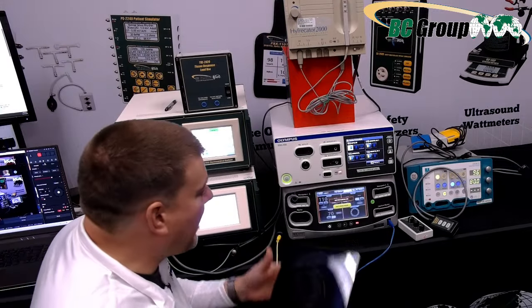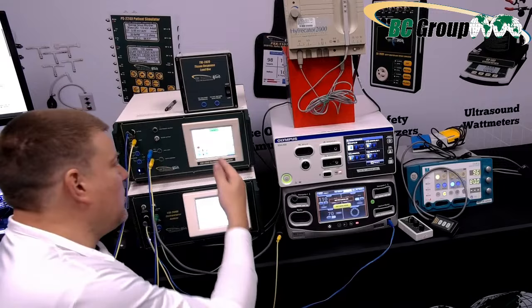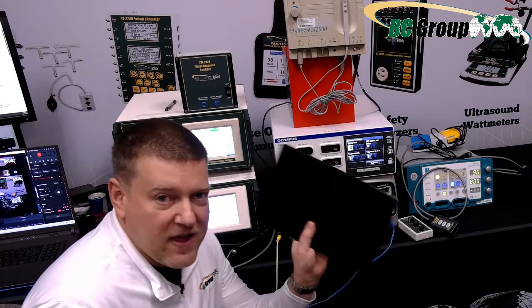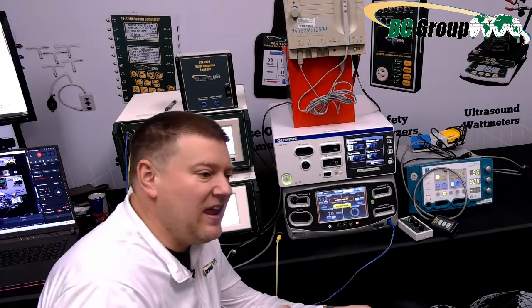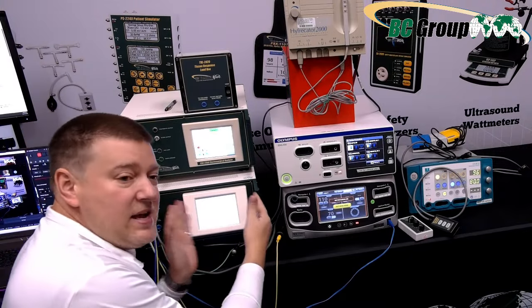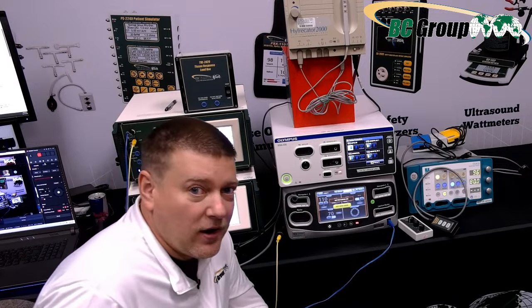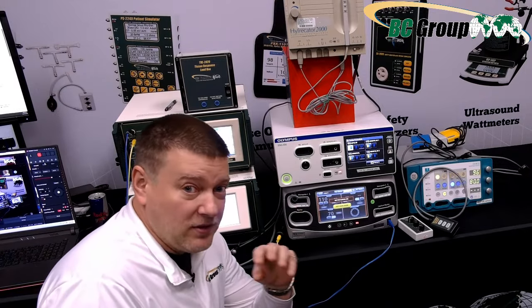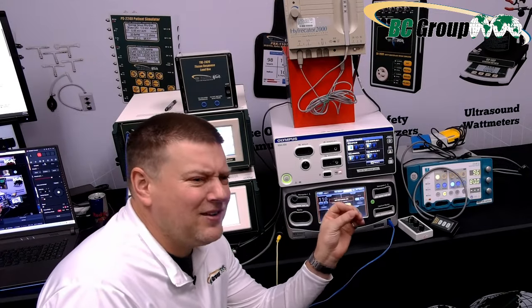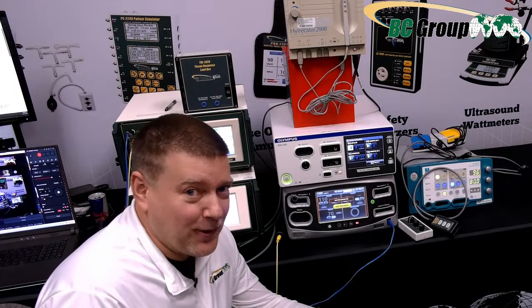This telephone operator and trying to guess what's going on where is no longer the case. We have pictures that show us what to do. We have apps that guide us step by step, and it automatically captures the energy and builds out a PDF report that you can attach to your work orders. Or if you are a professional level licensee, it'll automatically take those results, put them into your work order, and close the work order for you.